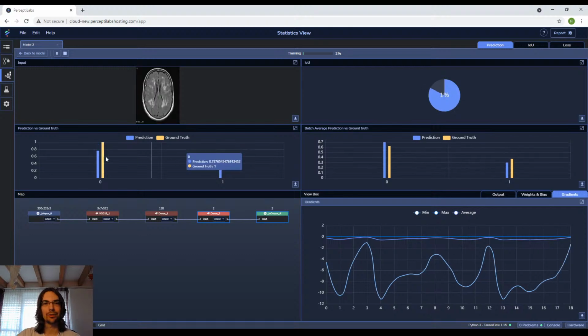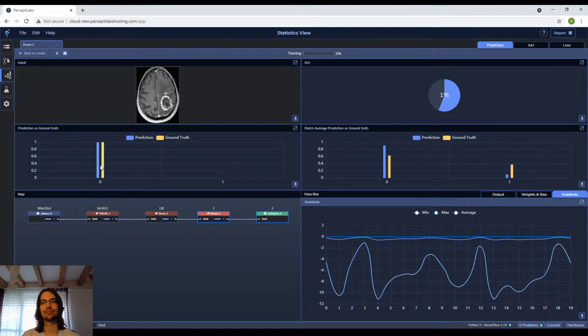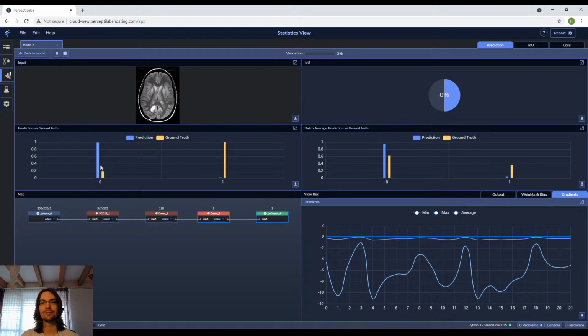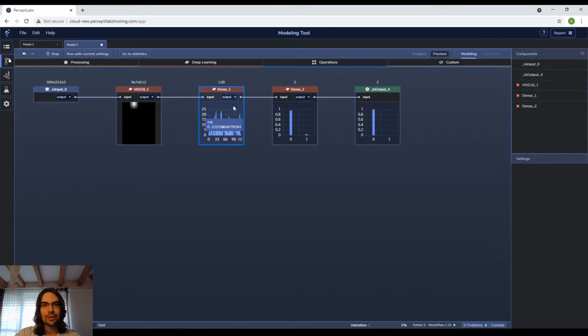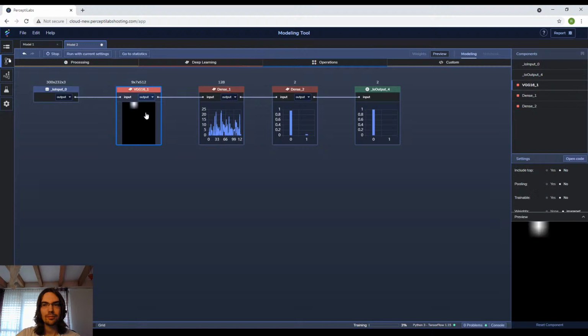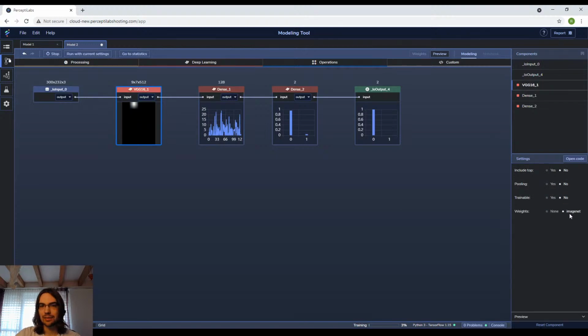You can see at least the samples we're looking at seems to be predicting all right. I'm gonna go quick back here as well to see if these two have the right settings, which they do. And this one looks fine as well.